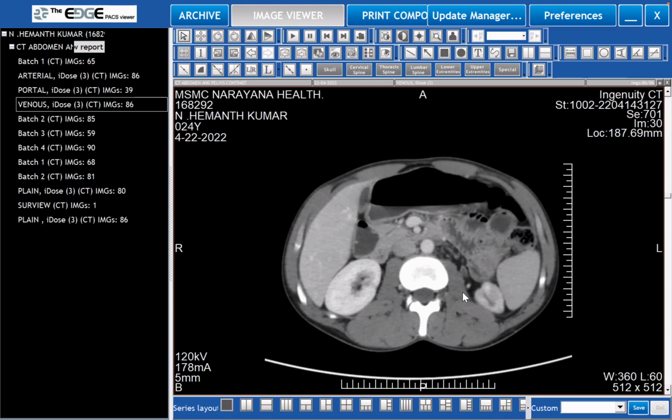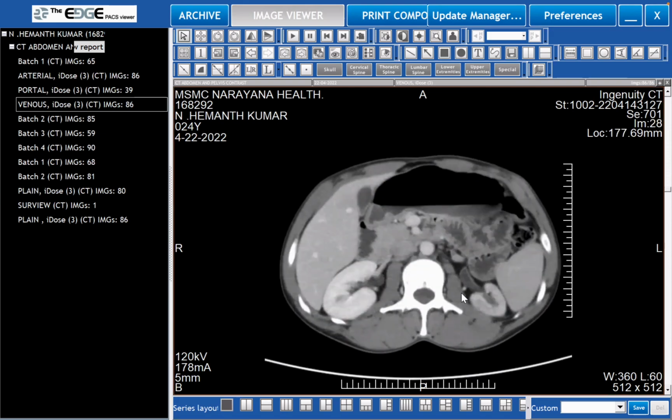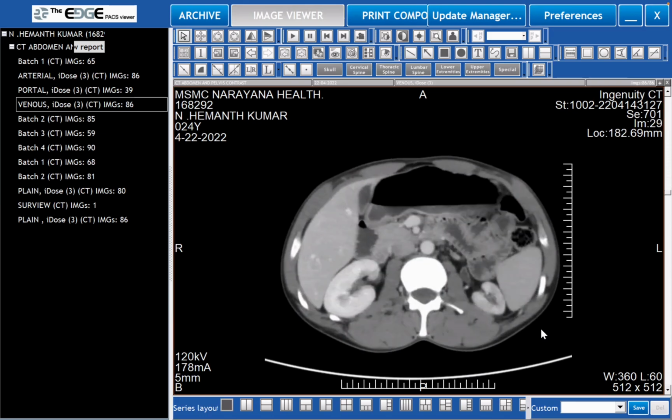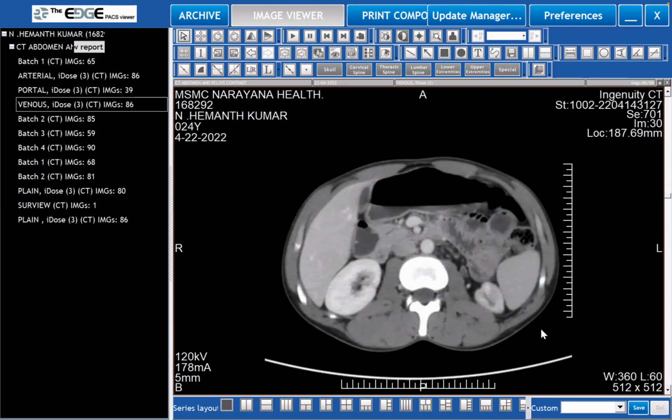You've got a dilated pelvis, you may argue and say that, oh, this could be an extrarenal pelvis. But an extrarenal pelvis should have no business to be having a thickening of its wall. You have a dilated pelvis and the PCS is not dilated. And this kidney is poorly excreting at this point. So you go down and look at the rest of the ureter and see whether the same phenomenon occurs there.